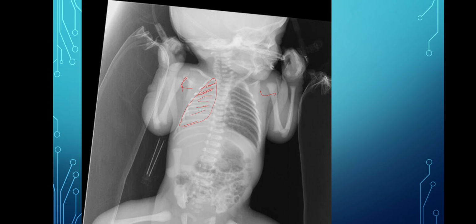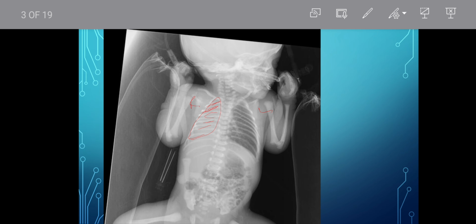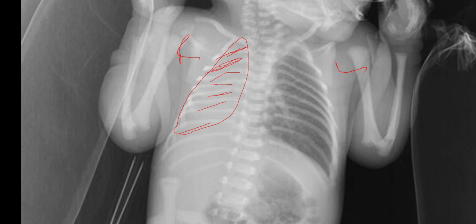If this X-ray showed bronchovascular markings, then it would be a collapse with patent bronchus. But in this scenario, no bronchovascular markings are seen, and no air bronchogram is seen. If the air bronchogram and the bronchovascular markings were there, then it may be a diagnosis of collapse consolidation with patent bronchus. But there are no bronchovascular markings and no air bronchogram.